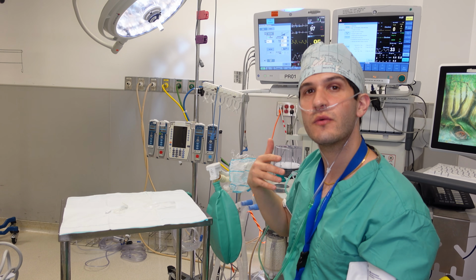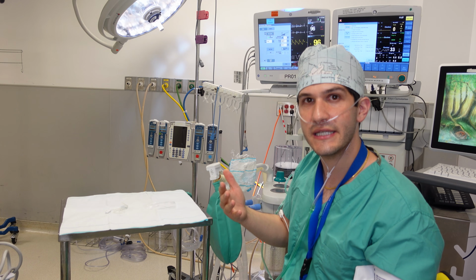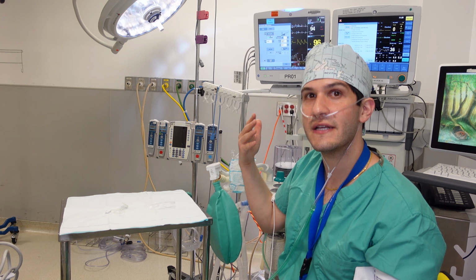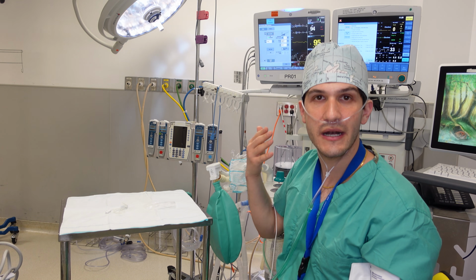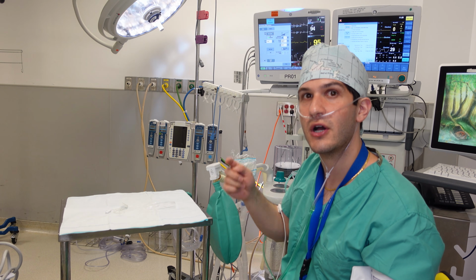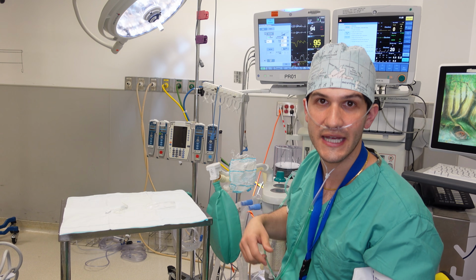And so again, this is one of those things that you have to think about when you're in the operating room. You get busy, you're taking care of a patient, administering drugs, and the blood pressure cuff has finished cycling. I want to make sure that I'm notified about it. So I need to make sure that this alarm is loud enough to cause me to turn my head and look at my monitor once the blood pressure has finished cycling.